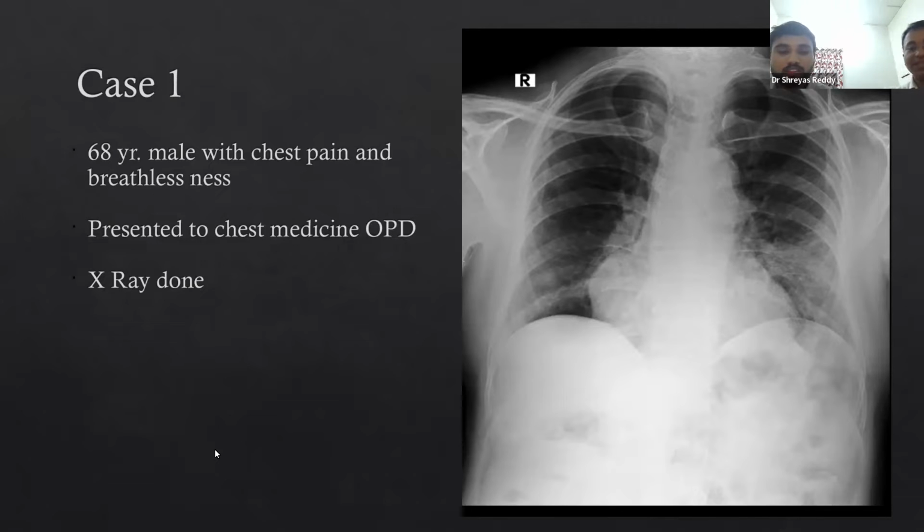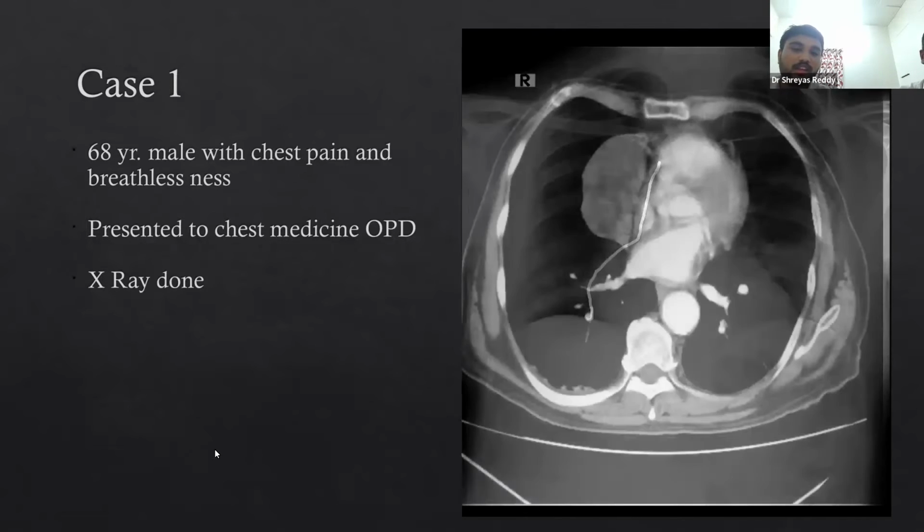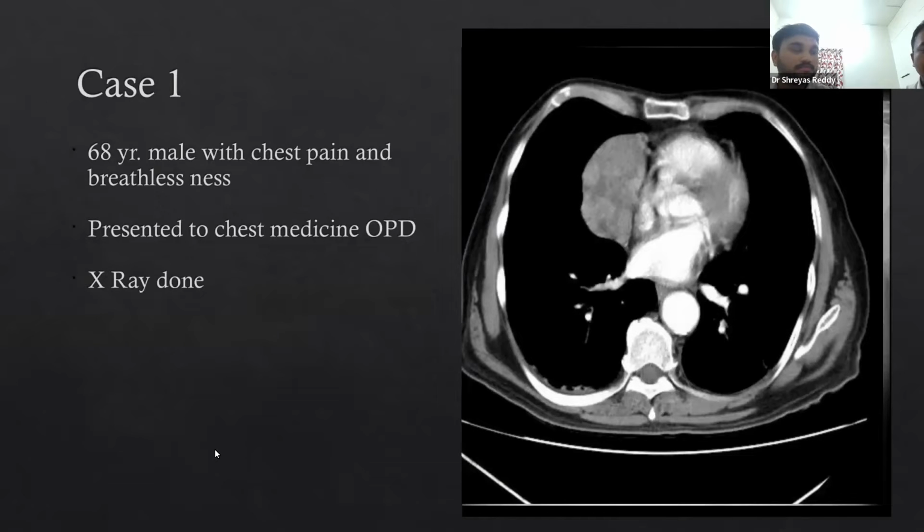Okay, we'll proceed. We'll not go much into this here because this is not a session on this. You have a picture of a middle mediastinal mass now currently given to you. So how will you proceed next? I would like to do a contrast enhanced CT of the chest. Yes. Okay, that was the mass which is silhouetting the right heart border over there. Can we proceed with the CT now? Just briefly, if we go into the cine views it will be too much. So I'm just putting the spotters here so that it can be easier for the discussion and we can go into the questions directly.